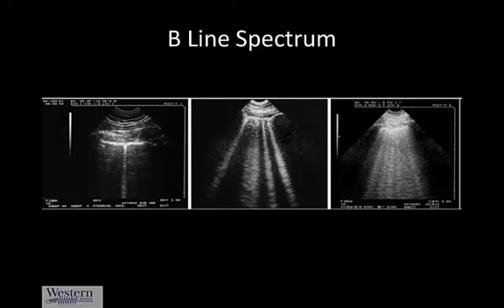of respiratory failure. So there's obviously a spectrum of the burden of B-lines you can find in any ultrasound window, and a single B-line we all harbor every once in a while. We all kind of accumulate a bit of fluid, but as soon as you exceed 2 and you get into 3 or more B-lines in an ultrasound field of view, then you start thinking it's pathological. And so here we see kind of a pathological number, and here we see almost coalescing B-lines in this rain shower kind of appearance on the lungs, which is much more severe.